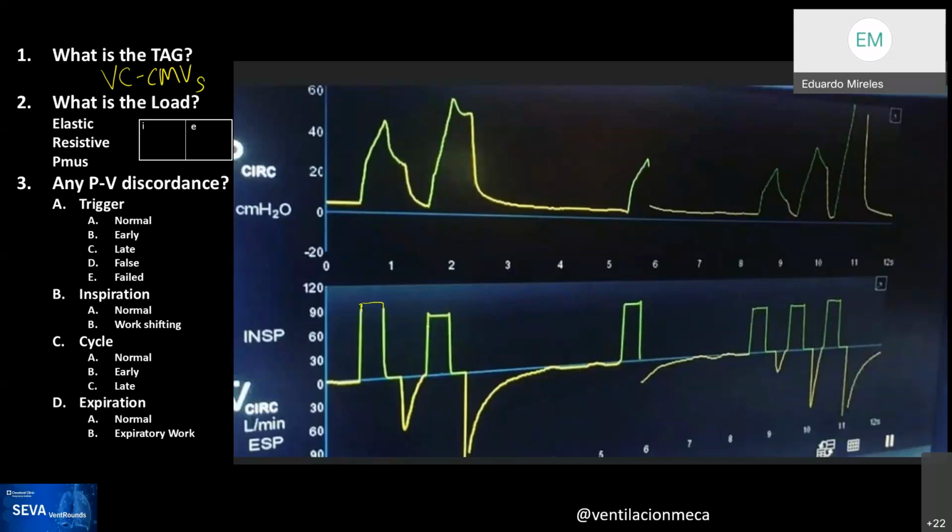Now, the odd thing here is that we see different flows. And actually, probably the best example here is this one, in which it goes from this amount of flow. And you can see how the next one looks a little bit higher, and the next one a little bit higher. And for a while, I thought that this was like an optical illusion, right? I said, well, maybe it's perspective, right? But if you look at the first one, you see exactly the same. You see the differences in the height of the flow, which didn't make any sense to me.